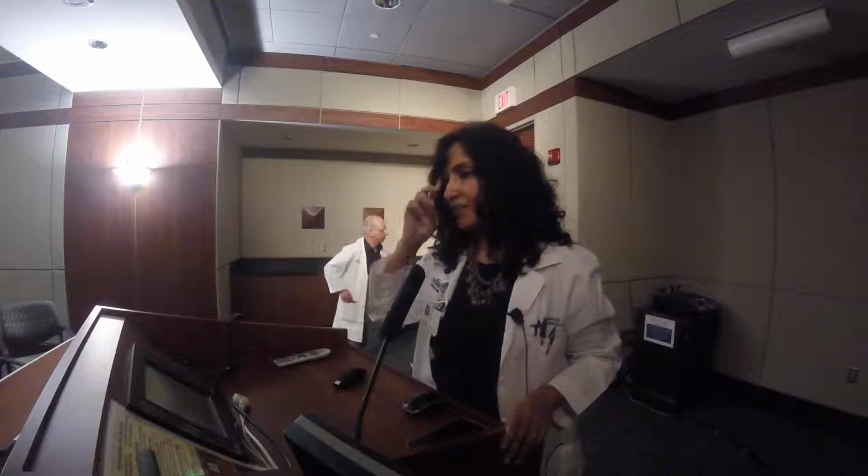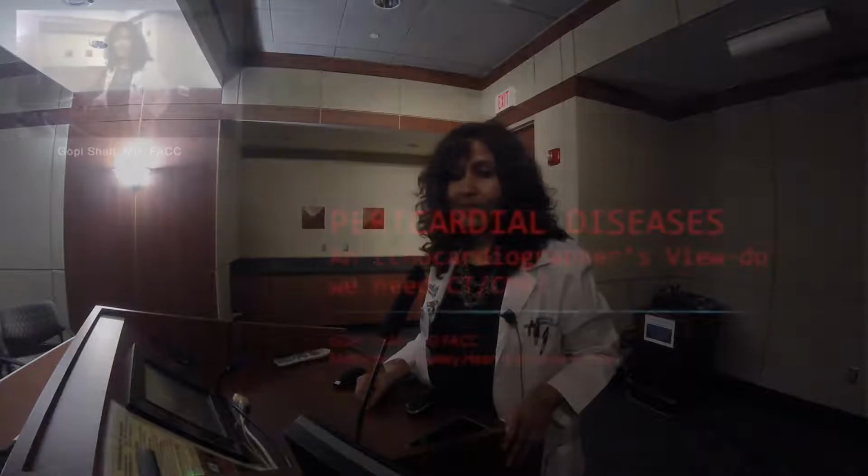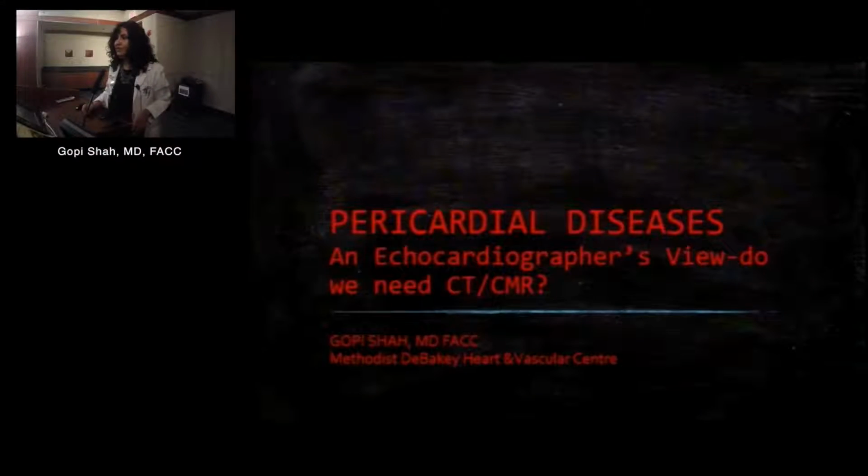This afternoon, we are going to be talking about the role of multi-modality imaging in the imaging of pericardial diseases. I'm going to start off representing the echo view. What is new in pericardial diseases? Nothing much in the last 12 months that we have talked.